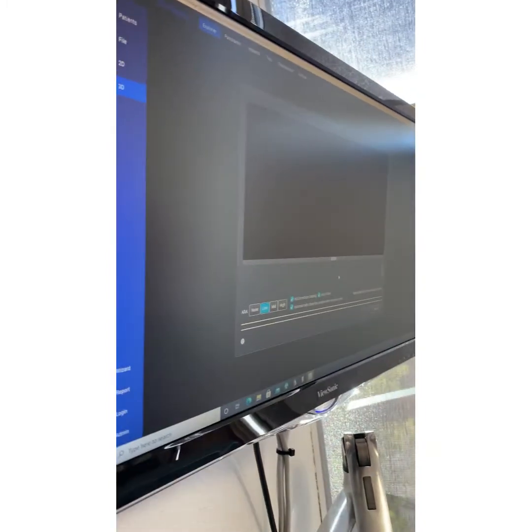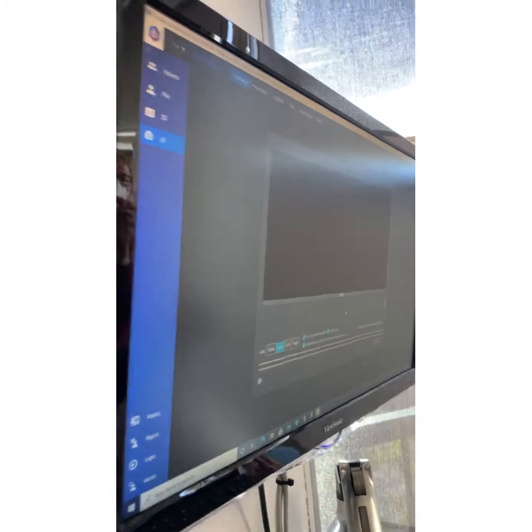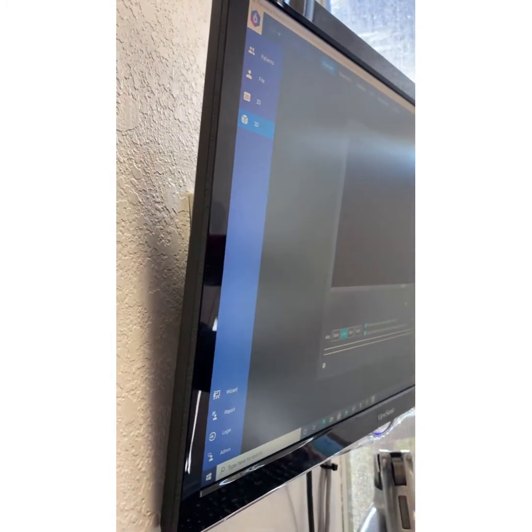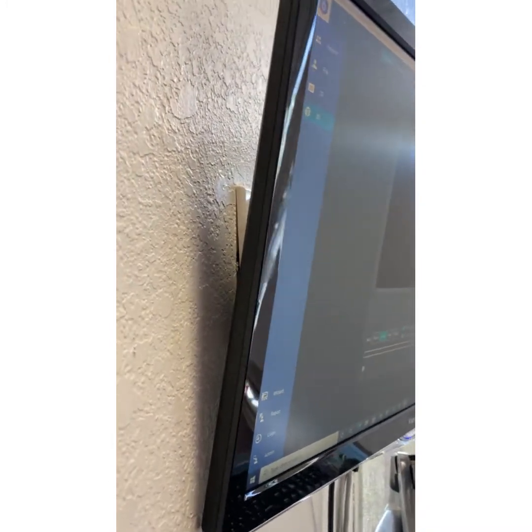Now, once we click this button on the first patient, you will never have to click it again. It's a noise reduction filter. It'll always be clicked. It defaults to that. Once you take your first image, it will be unclicked the next time you open it, but when you take your first volume, you want to click it, and then it'll always be clicked.